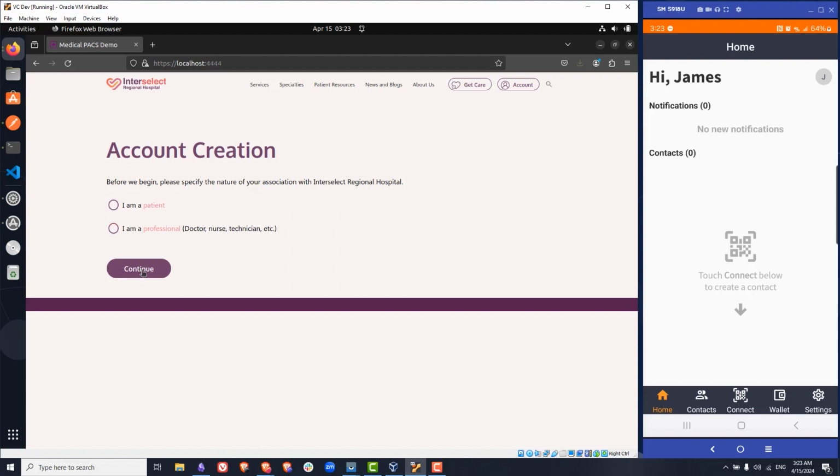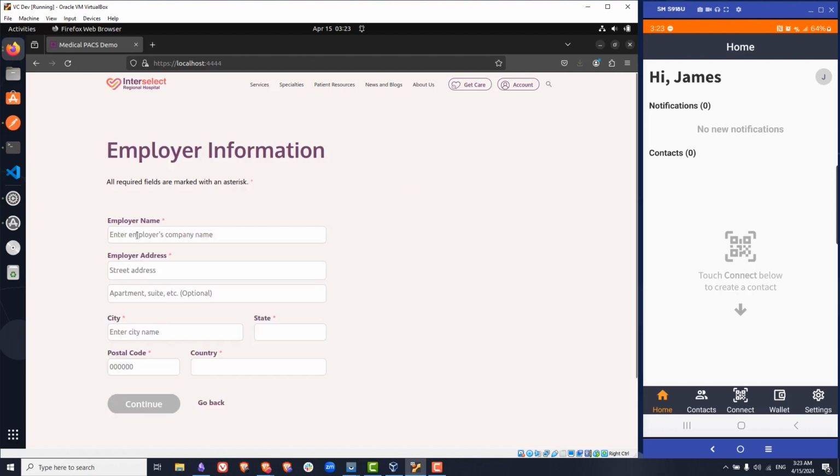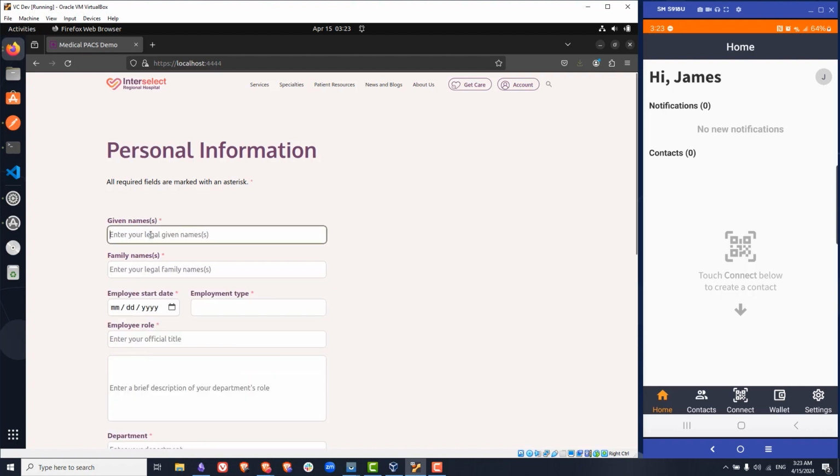So we'll create an account. We'll be a professional, but it's the same hospital. But this time, instead of being Mike, I'll be James Hansen.